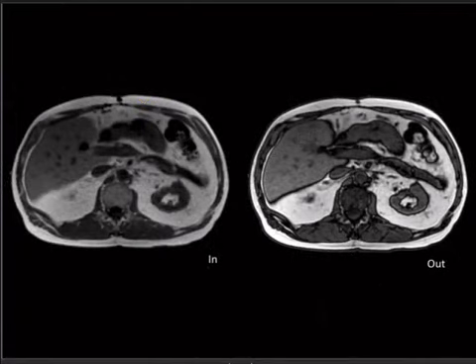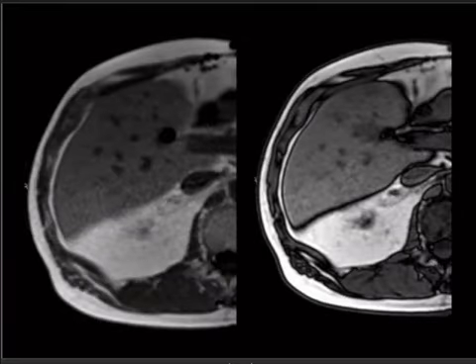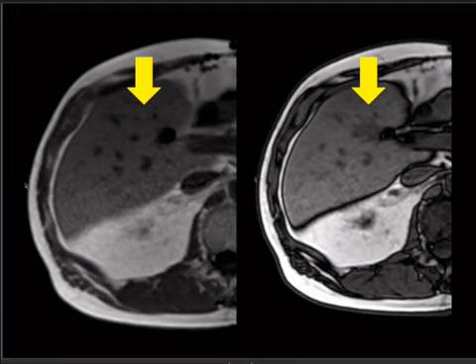You're also nicely provided with some MRI sequences, and anytime you're given in and out of phase imaging, you need to be thinking about a fat case, right? So in and out of phase, it's going to be a fat case. It's going to be an adenoma case. It's going to be a focal fat case or a focal fatty sparing case, and obviously that's what this is going to be.